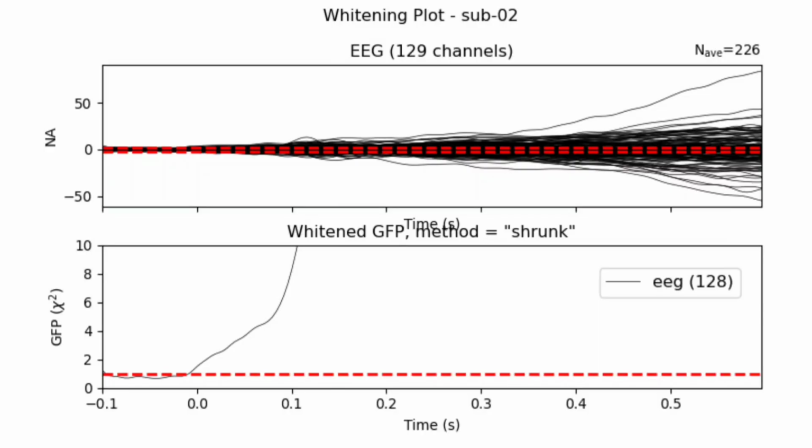What a good plot looks like. During the baseline, before zero, the channels should look like random noise bouncing around zero, mostly contained within the red lines. After the stimulus, after zero, you expect the channels to jump out of this range. This is your brain signal, the ERP.